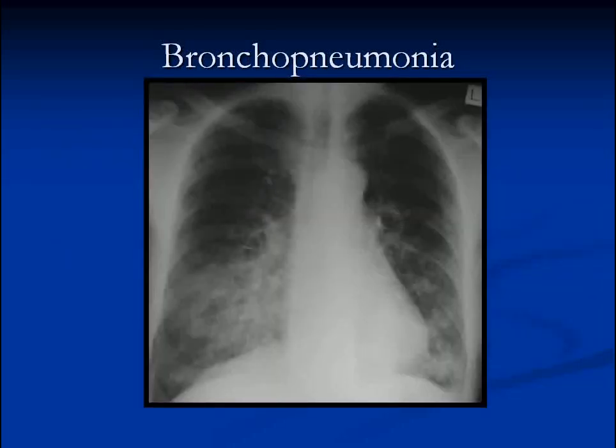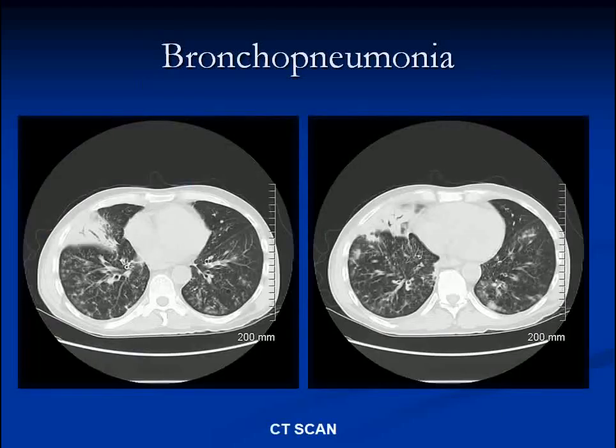Here again, we can see a bronchopneumonia. You've got consolidation involving almost all of the right lower lobe, taking out the middle lobe area as well. Centrally involving the left hemidiaphragm, the apex of the heart is gone, and all of these patchy white areas all over, and this is a bronchopneumonia. If you look centrally, you can see one bronchus which is thickened and coarsened centrally. This is what a bronchopneumonia looks like on CT scan. Bilateral patchy airspace consolidation. You can see that one area in the right middle lobe where there's actually an air bronchogram. Can you see the peribronchial cuffing? All the bronchi are really thickened here.